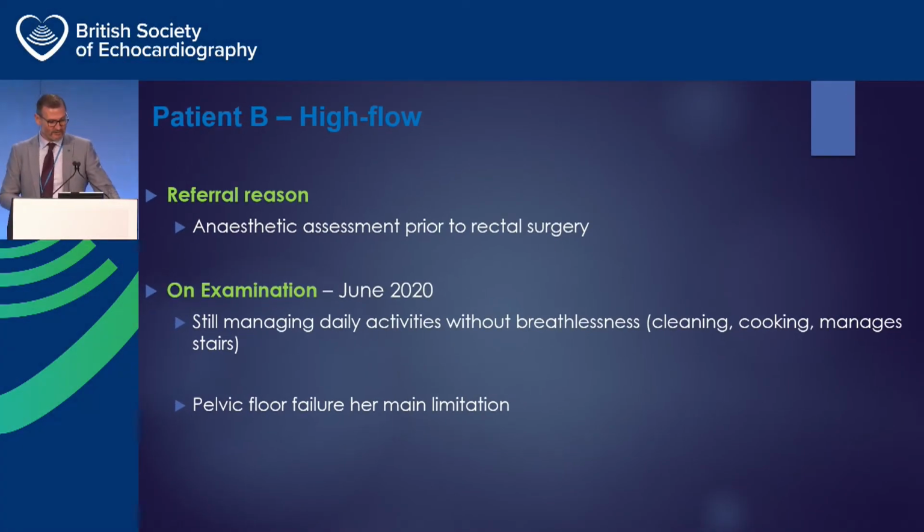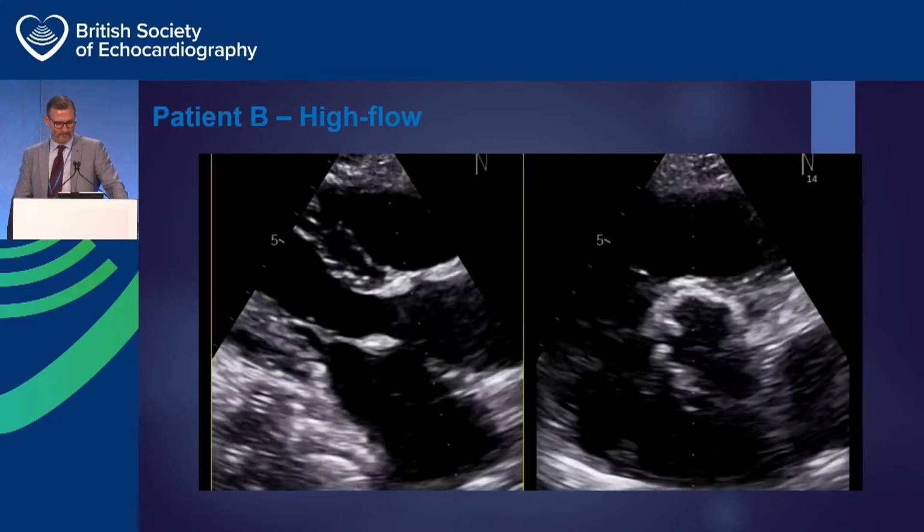So going back to our patient, she's had an anesthetic assessment prior to her surgery. And that's why she's having the echo, because of her previously high gradients. She's still managing her daily activities without breathlessness. So she's cleaning, cooking, manages the stairs, and her pelvic floor failure is her main limitation, keeping her nearly housebound. So let's have a look at her echo.